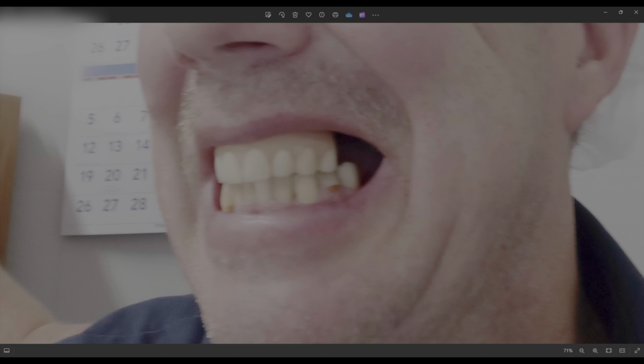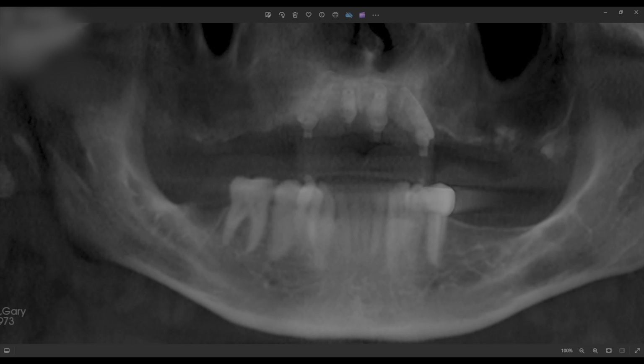Yeah. And the implants were probably placed anteriorly due to the big sinuses. Right. So typically, even before we looked at the x-rays, we knew that was a big possibility. So let's look at his x-rays that he sent me. All right, so I know you guys have no idea what you're looking at, but this is actually a slice of a CBCT, the 3D scan. You could see he's got 4 implants here, and he's got very large sinuses, right?